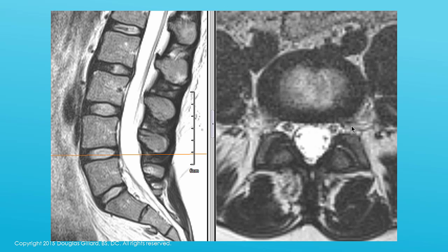Can read through that. Oh, what do we got here? This doesn't look like an X-ray or a CT scan. Was just a fancy three-dimensional X-ray. This is called an MRI, and we are going to look at tons of these. You're going to see a lot of these when you get to my class. Every day we're going to look at different things. These are showing up more and more in the boards, we're told.